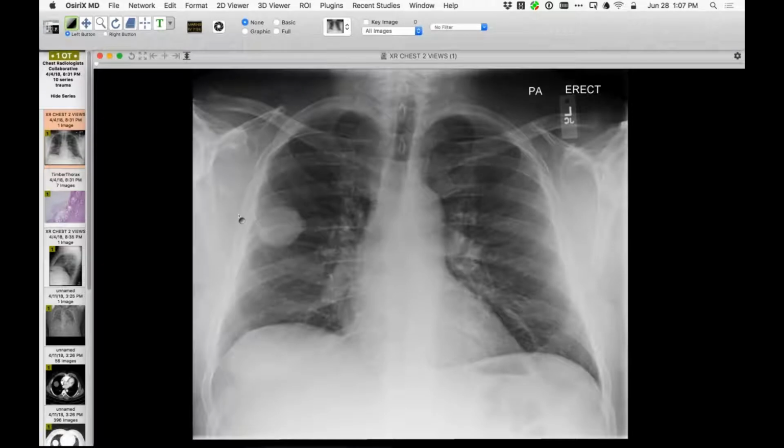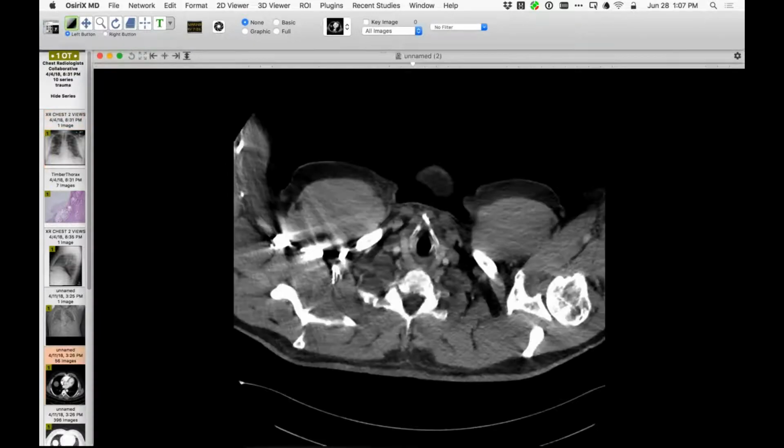I'm not really sure that the patient's symptoms or the presentation has to do with the observation. The patient was seen at a clinic, and I'm not entirely sure what the presentation was. I don't think it was any kind of acute febrile illness. So, of course, an observation is made of this rounded opacity in the peripheral right hemithorax, for which, not surprisingly, further evaluation was performed.